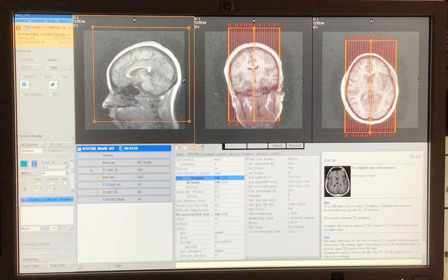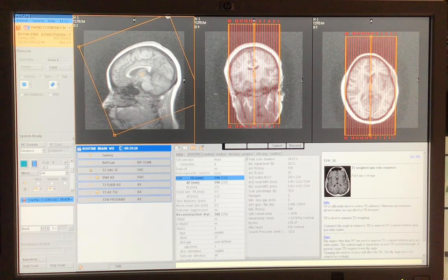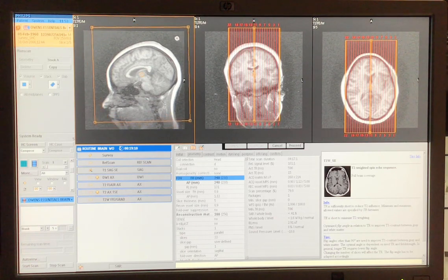If by chance you had this head tilted way back, like on some real kyphotic patients, you can now change the angle of how you want to hang the head up by changing your field of view. So I kind of look at my field of view box as my picture frame. How do I want to hang it on the wall? How do I want this brain to show up for the radiologist to view, right?